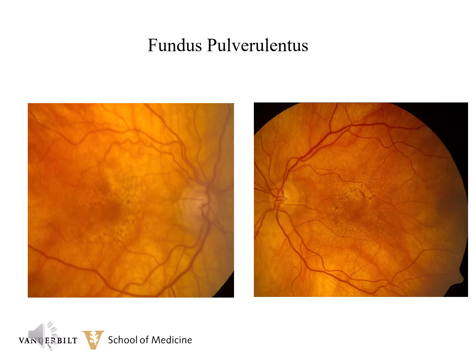Here are some color photographs of a 70-year-old gentleman. His vision is reported at 20/25 in both eyes. You can see some very gross pigment mottling and changes, but there are no drusen in either eye. Now, there have been some reports that this pattern of the Fundus Pulverulentus has been seen with angioid streaks as well.